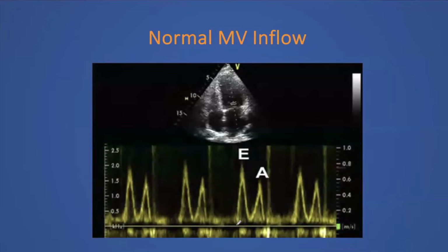So what is this? What do they call this signal? Modal velocity. What do they mean by modal velocity? It's to be crisp in the outline.